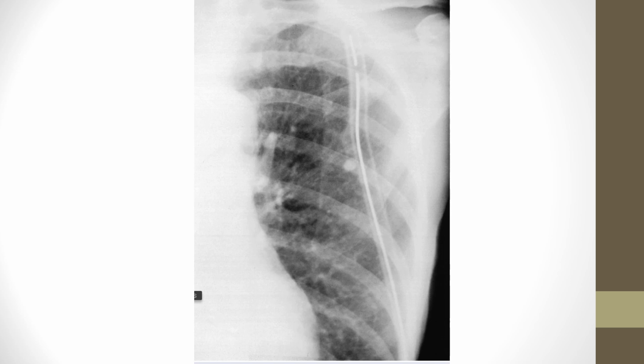So what do you notice in this picture? This is showing a chest tube, and you see the radiopaque line in it. And you see all along the tube, it's thicker in the middle, and it has that radiopaque strip on there. You can see the edges of the tube, and you can see where it can be placed into the soft tissue or anything else. So we just want to make sure we're seeing the tube in the right position.